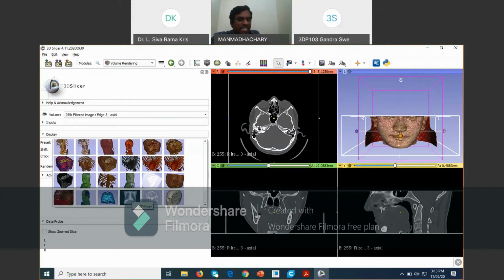And this is only X-ray. I want only X-ray for the tissue, that also you can extract here. Here CTA. Suppose they require only airflow analysis. Suppose gastric problems are there, and we are using some CT air analysis. That also we can do. Here the predefined library is directly available. In some software, you have to define your own.